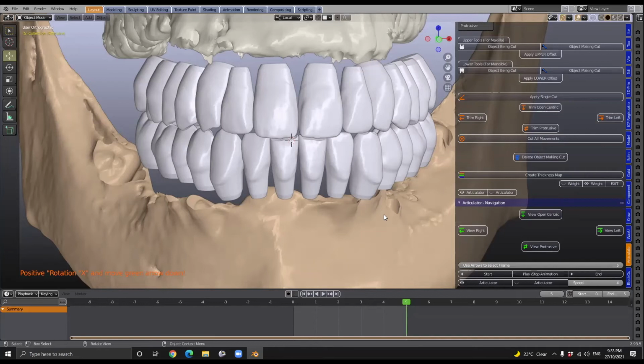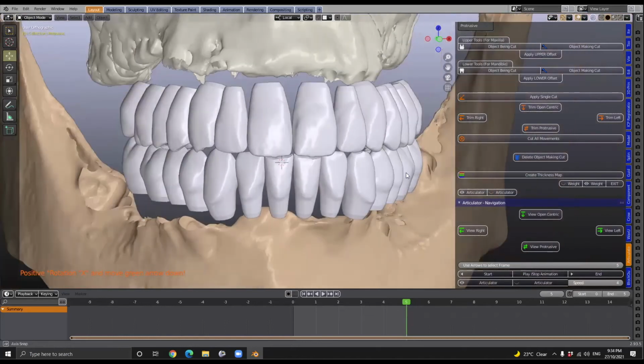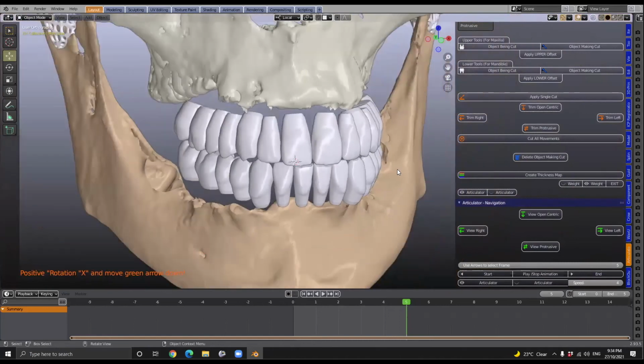Look, to be honest with you, I would probably say get the cutting and the articulation over and then continue doing the crowns, because it is quite complicated. You can think about the lower jaw needs to be animated. If you've got the tooth library already trimmed the way you have, it is probably easier then to connect them up to the surfaces that we create in the crown module. So I would probably say get the cutting over and done with, and then, if you're doing one crown, for example, it's fine, you can do it while you're doing the crown. But if you've got a very large case, something like this, I would get the cutting done and then continue. Okay, that's a good thing.